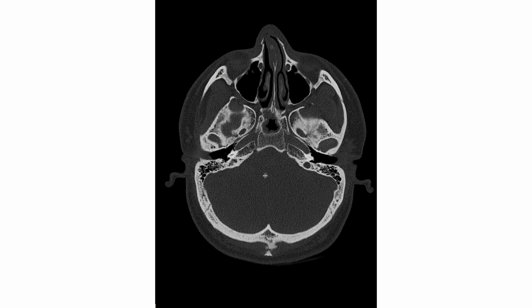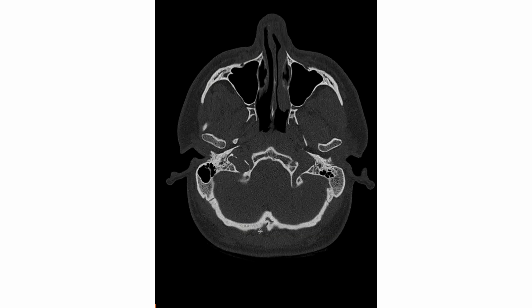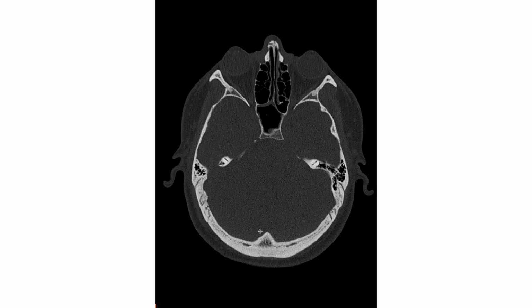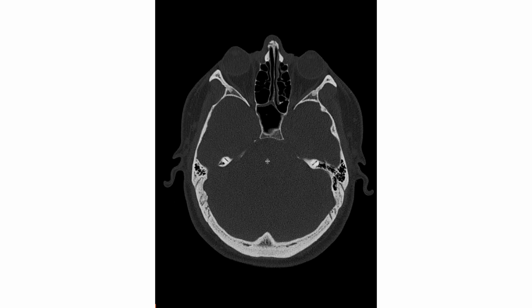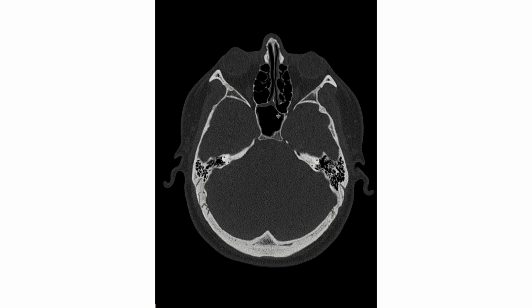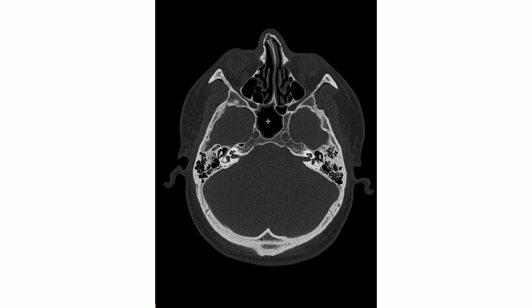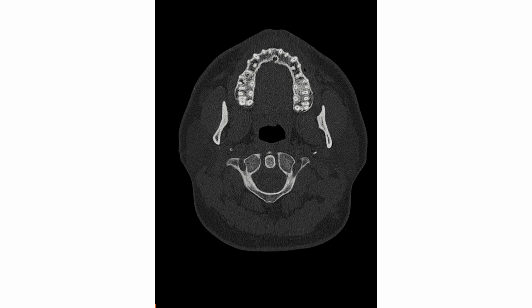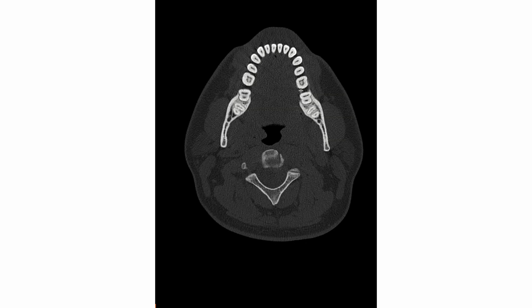This area is also a common blind spot that, if you don't look at it, you're just going to miss it. So it's very important to look at the skull base and clivus. Then it depends on how your institution performs these head CTs and the area that you're going to see in your field of view. So I see these ethmoid sinuses, these maxillary sinuses, these sphenoid sinuses with some mucosal thickening, and then I see the maxilla. I look at it, there are some periapical lucencies. These are very common in people. And then this is the mandible at the end.